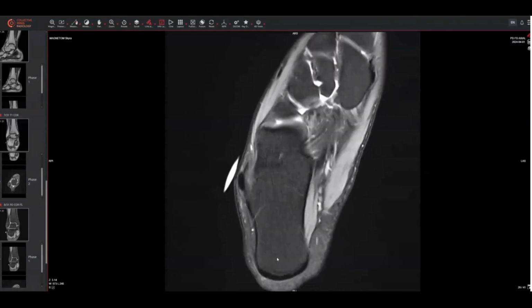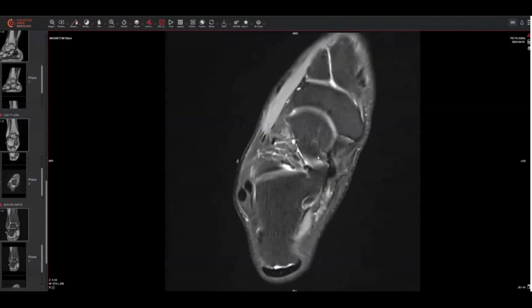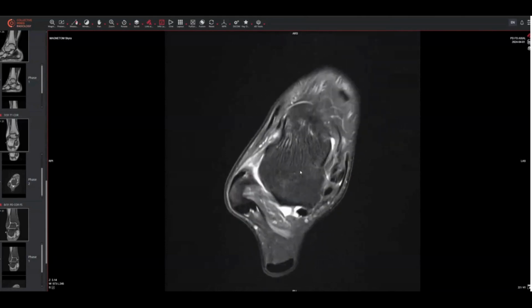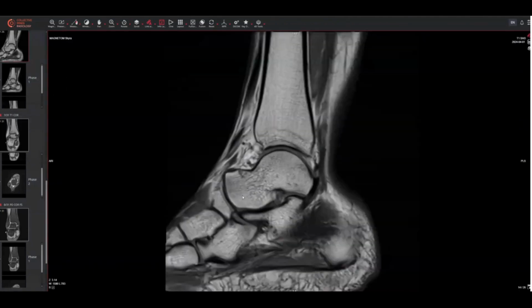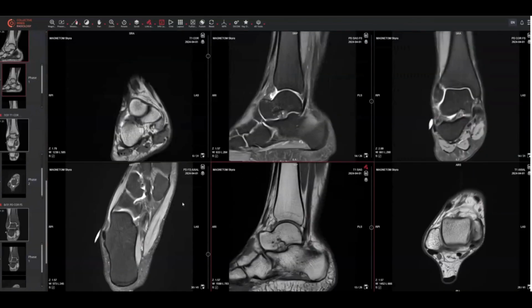And for those patients, when I think about whether this patient has varus or valgus, what I think about is that this patient has a slight hindfoot valgus relative to what would have been the normal compensatory mechanism of this person's cavus. And that is the reason why it seems to be difficult to measure, because I think that on one side of the articulation, on the lateral side, we have this offset and then it normalizes medially. So we have supination occurring, but where is it occurring?